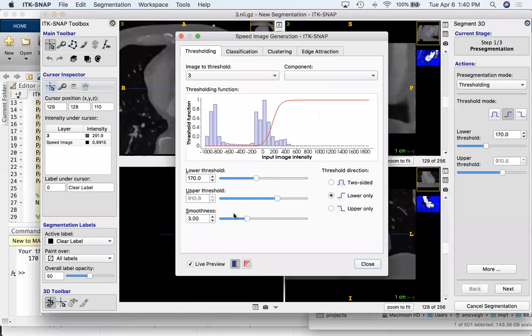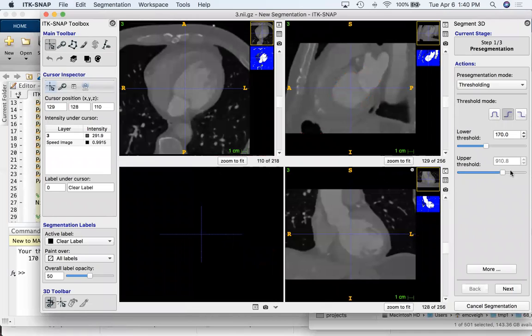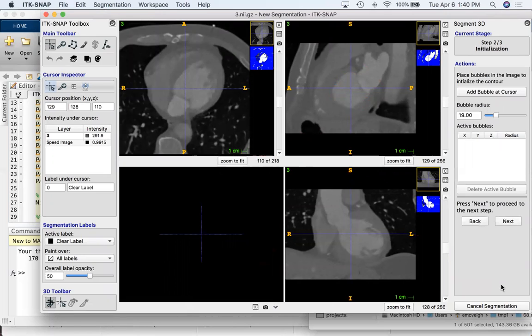You don't adjust the contrast when you load the image? No, I don't do anything to it. Basically, I just run the segmentation based on this number. That's the only thing I'm doing.